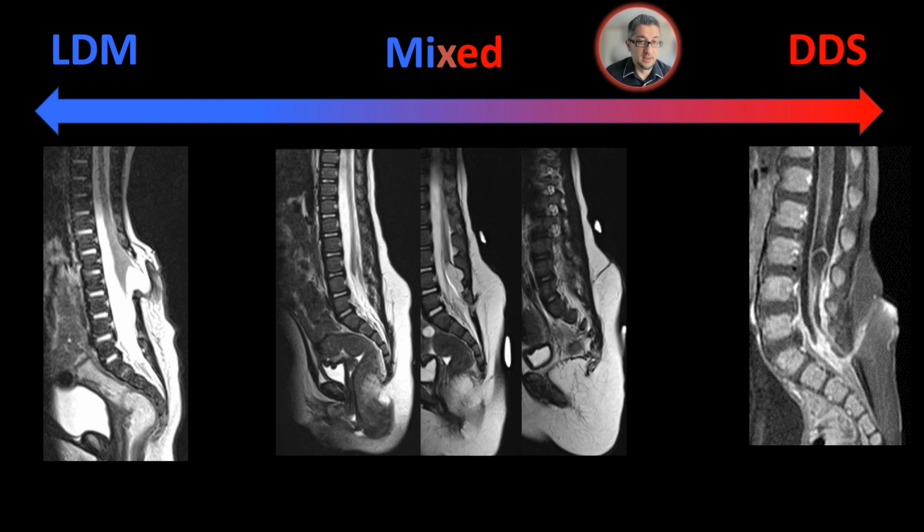And here is, on the one hand, limited dorsal myeloschisis, on the other hand, dorsal dermal sinus tract. Here, in this group, for example, this one is associated with dorsal lipoma, and there is this tract, but it's not a real tract. And this is a real tract and infected. So what are the differences? How do we differentiate them from dorsal dermal sinus?